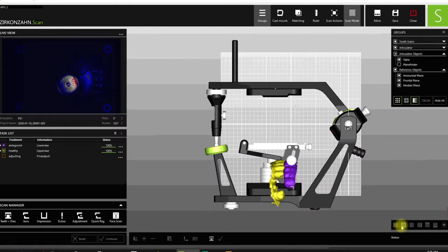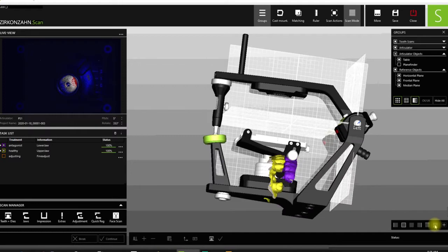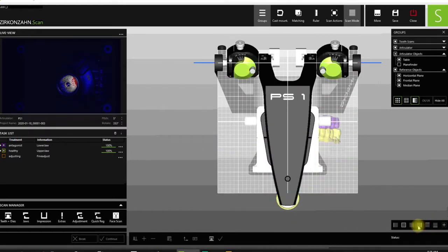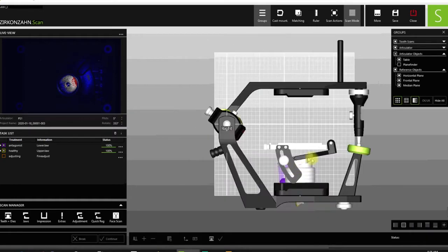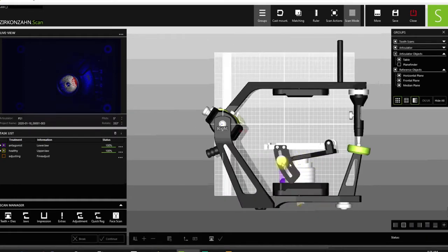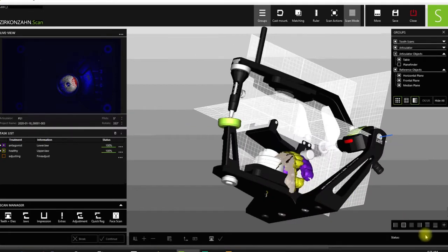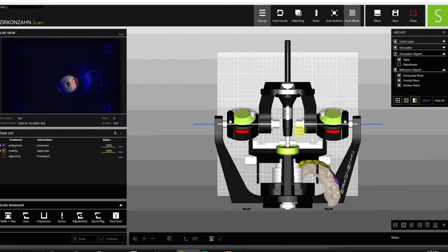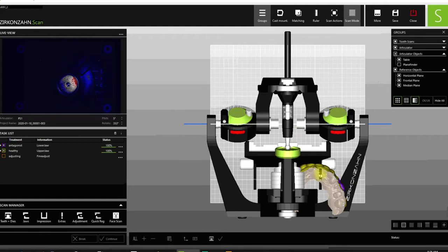So this one is the lines on the left, so you're looking at it from the left of the articulator. This one, the line's on the bottom, so you're looking up at the articulator. Try to move the thing around using these, because if you start to get in the habit of doing it this way, it always winds up crooked and you're going to make mistakes. So use these when you can. All right, now we have to move these two scans to where they're supposed to go.